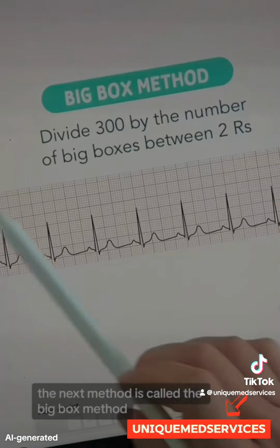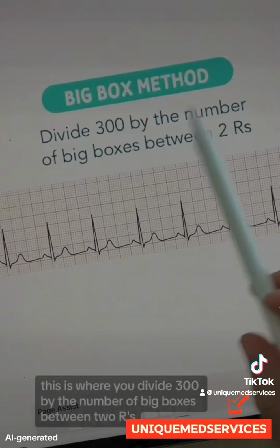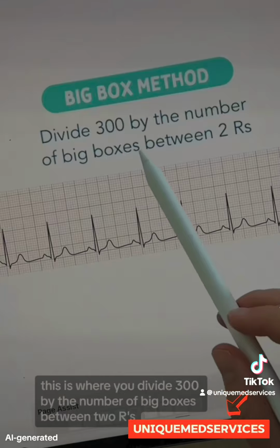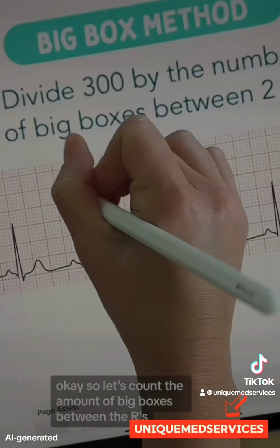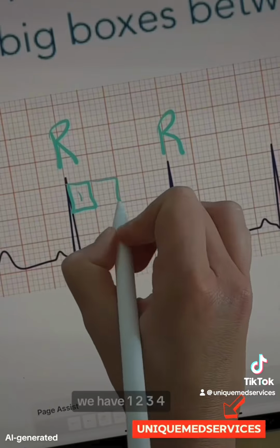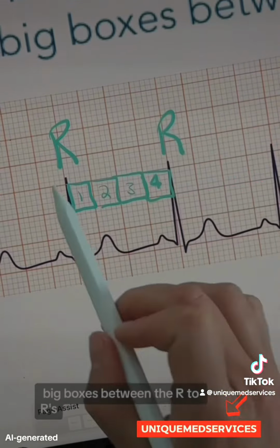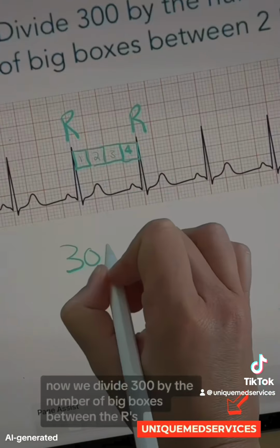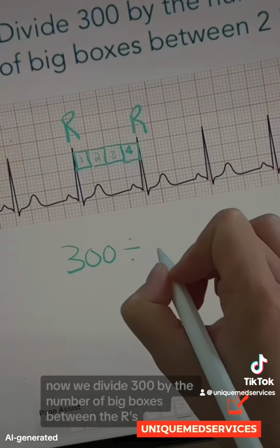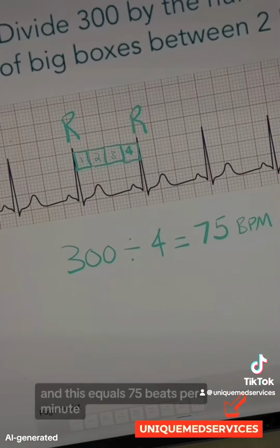The next method is called the big box method. This is where you divide 300 by the number of big boxes between 2 R's. Okay, so let's count the amount of big boxes between the R's. We have 1, 2, 3, 4 big boxes between the R to R's. Now we divide 300 by the number of big boxes between the R's, which is 4, and this equals 75 beats per minute.